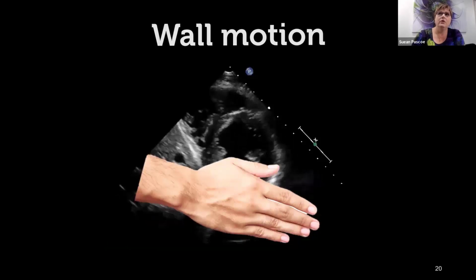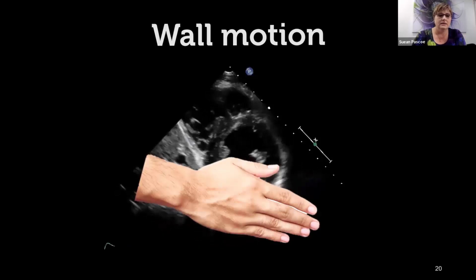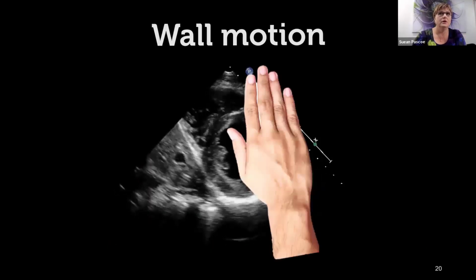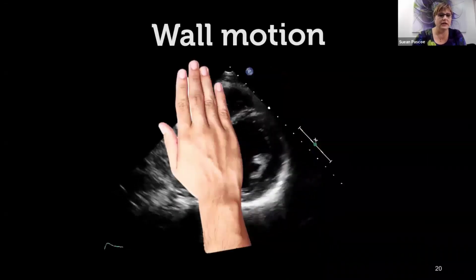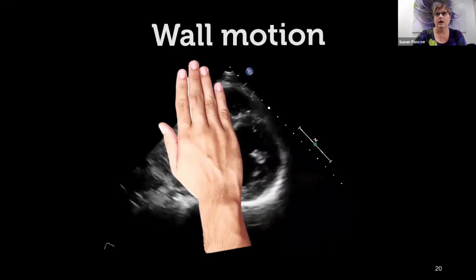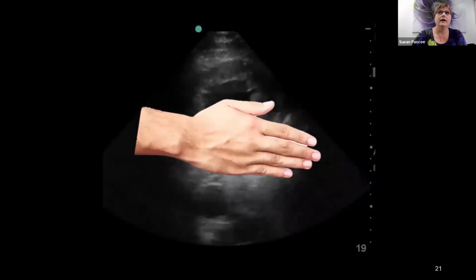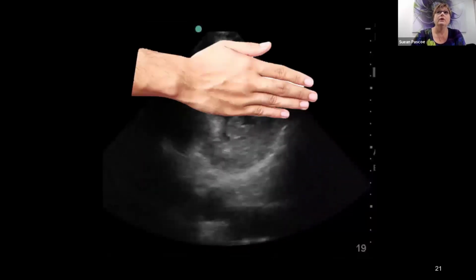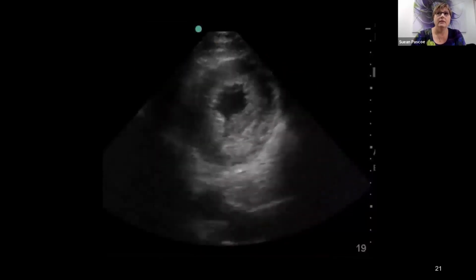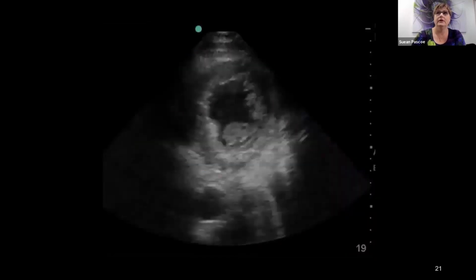So you can see when you've got a normal wall motion, it all squeezes towards the center in systole. You can do it either side as well to help you narrow down on where it is actually not moving in the right way. So as we look at this one here and we cover it up, the top doesn't look too bad. It looks like it's squeezing and the wall thickness is increasing slightly. But when we look down the bottom, it makes it easier to see where the, hang on, let me get that video going again.